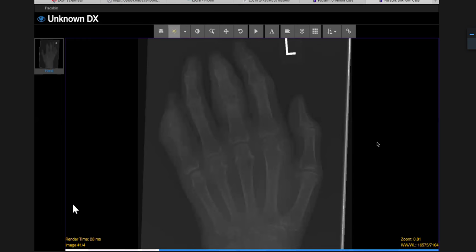This is just a tip for you because you got the right diagnosis, but I would be really careful with the description you're giving, because it almost implied that you were going to call this something malignant. If you want to call something lucent, to me that's a less aggressive term to use, but for me, lytic means destructive. So, juxta-articular, punched out, sclerotic edges, overhanging edges, and usually you see it in the foot, but you can get it anywhere, and you can get it in the hands, as is seen here.